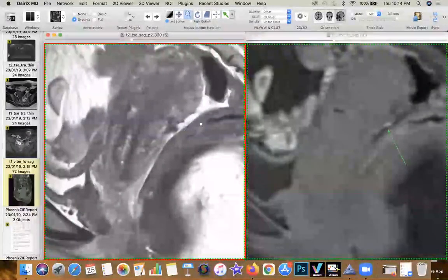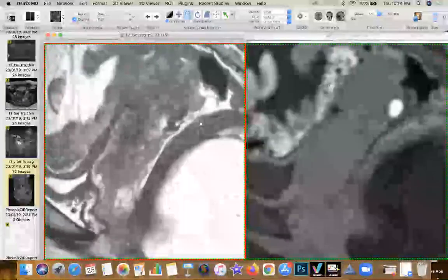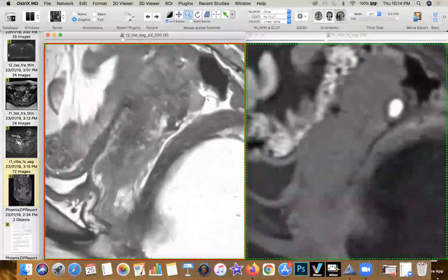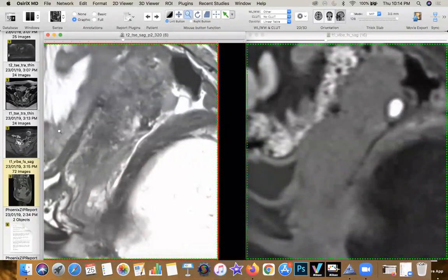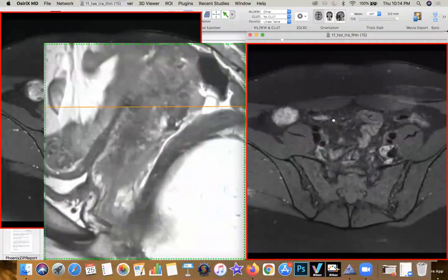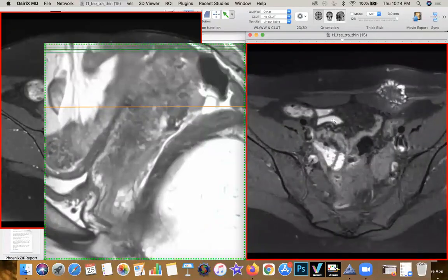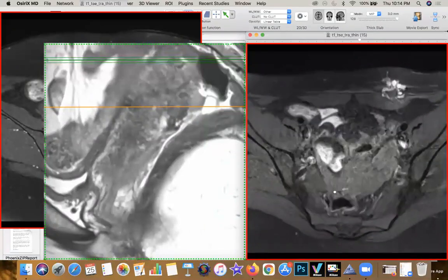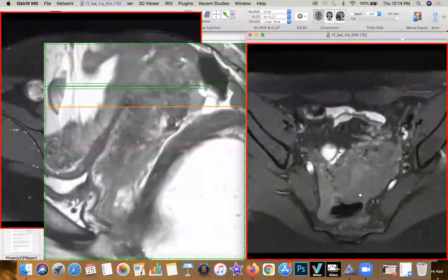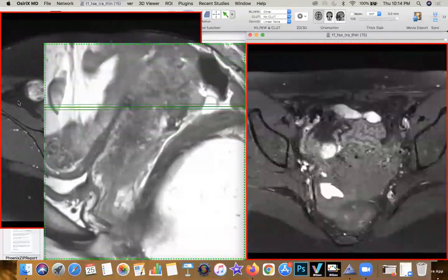And what do I start seeing? I start looking at these areas, and if I'm running through them gently, you can see that there are areas which are showing T1 shortening or T1 brightness interspersed among those areas of very low T2 signal. So I go onto my actual images just to verify what I'm looking for. I come down to the level of the corpus, and you can start now appreciating these areas of brightness which are now seen in relation to the corpus itself. So all these bright areas are very, very concerning.